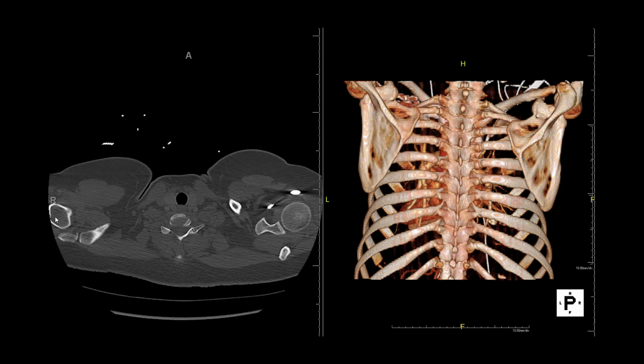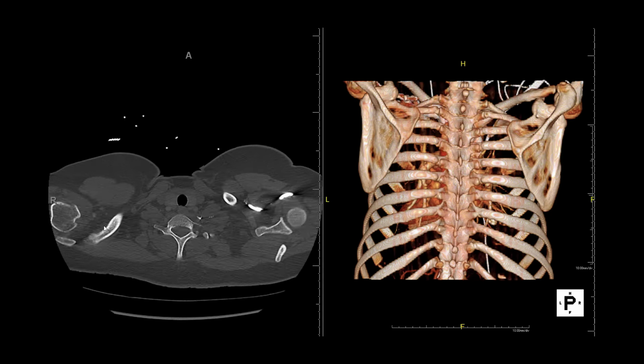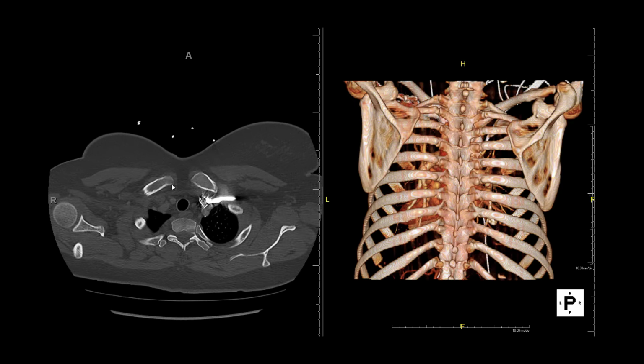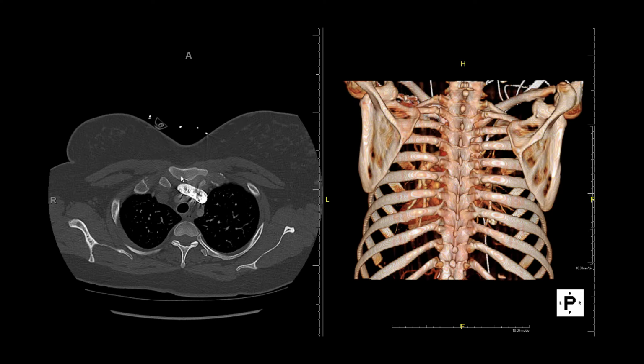Now the humerus and the upper extremity we will cover at a much later time point, but the clavicles here at the acromioclavicular joint will course inferiorly in this case, because the patient's holding their arms up, coursing inferiorly down to articulate with the manubrium.